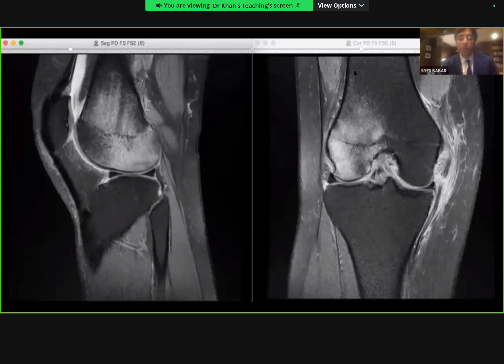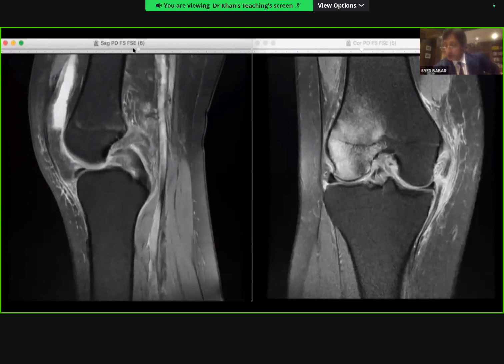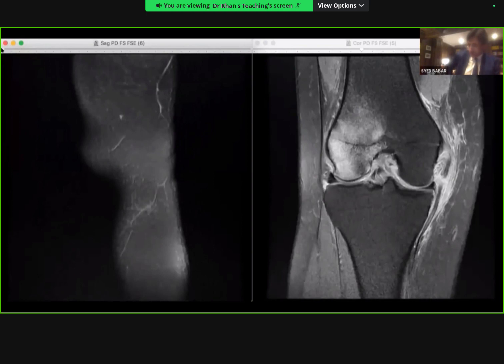Right, here you go, candidate 2. You've got the control. Can you just confirm that you have the control? Yes, you do. I've brought up the same sequences. So this is a 26-year-old, again, with a similar sort of twisting mechanism of injury. And the case is all yours.